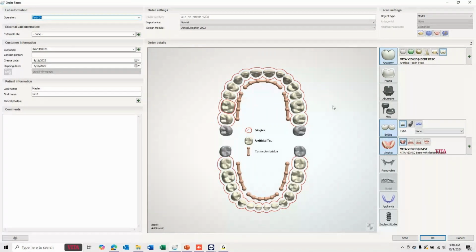You can also, because you're exporting it, do these teeth individually, just like the original Vigo was, or you can bridge them together. Since I'm manufacturing them and milling them out of the dent disc, I found that I like it better when I bridge it, but rather than bridging them all in a single arch, I usually will break it up like this, like the 6 anterior and then the 4 posterior. And you can do it either way.